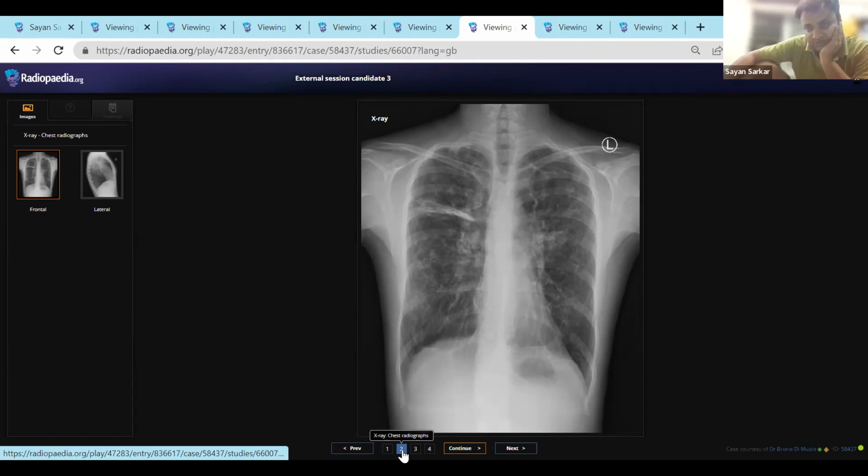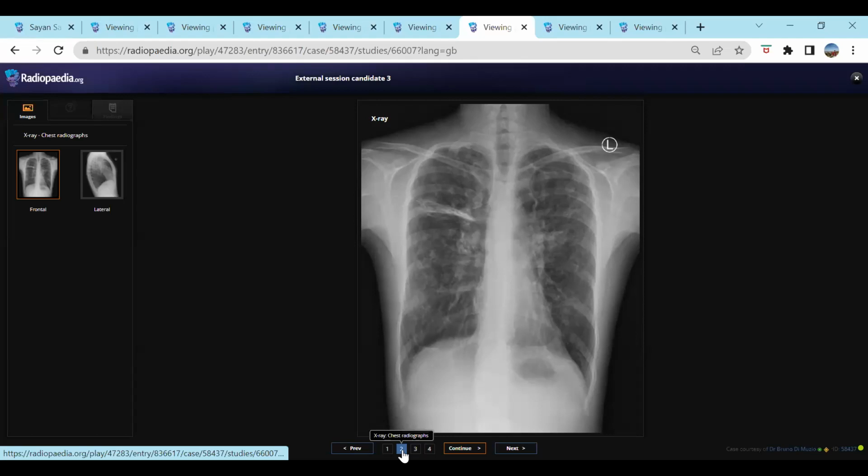Okay, fine. So what will you do next? I'll review the previous imaging for any interval change and the previous record of the patient if he's a known case, and the ultrasound of the abdomen, to see the abdominal manifestations of cystic fibrosis. What kind of abdominal manifestations are you expecting that can be seen on an ultrasound? Like liver changes, these patients are also prone to cirrhosis, and pancreatic atrophy and gallstones.